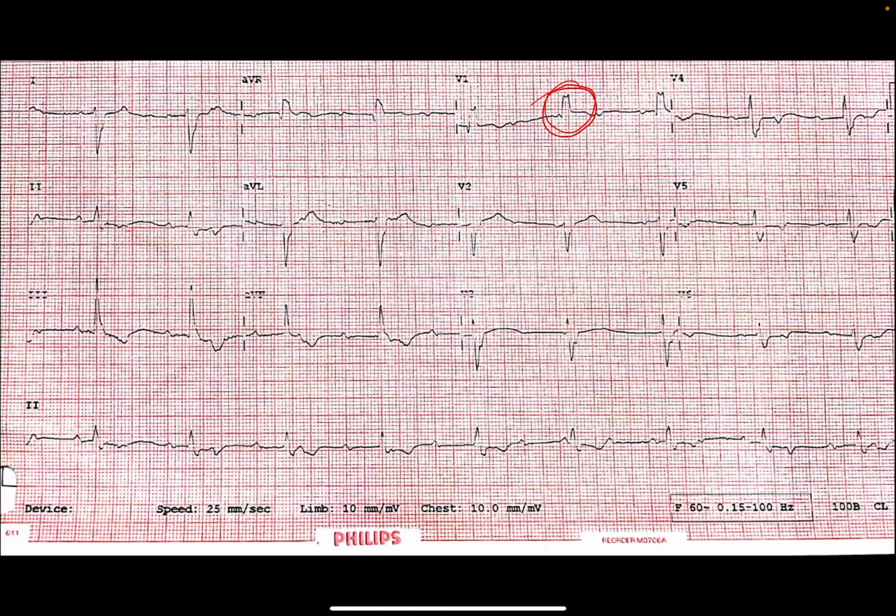So this morning we had so much doubt regarding whether it's a Mobitz type 1 block. Many people after seeing this ECG felt the PR interval is slightly prolonged here, more prolonged here, more prolonged here, and then people felt something like a dropped beat. Okay, so this is not the way. Actually, if there is a dropped beat here, what should have happened? There should have been no QRS complex at this point, and some junctional beat or some other beat would have come. But what is the thing here? Many people did not see the P waves properly here.